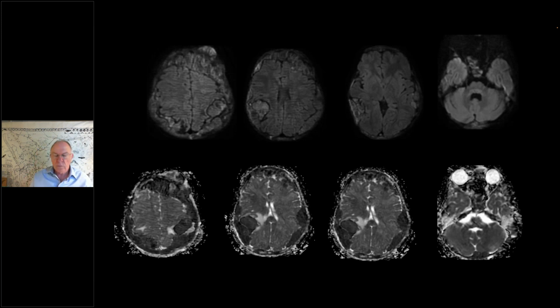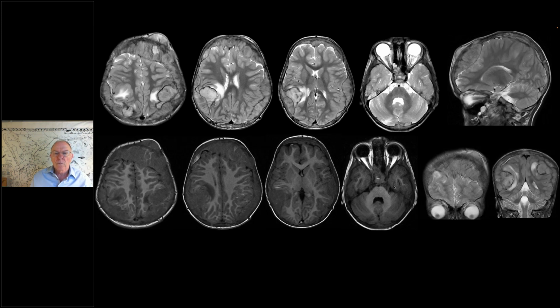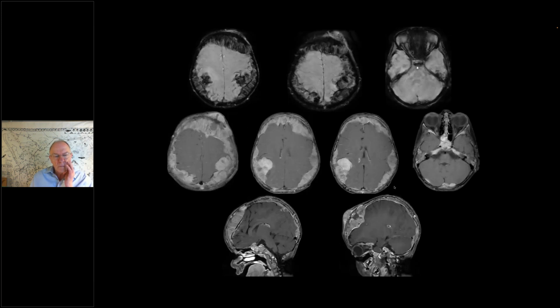I'm just wondering what's happening to the brain, because there's probably dural invasion, right, and edema within the brain, and those cortical folds appear a bit thickened, so there could be parenchymal invasion actually. And is the GRE hypointense, Nihaal, in this? It is blooming, but that is because it is involving the calvarium. Plus, it could be hemorrhagic as well, right? Yeah. So blooming, suggestive of hematogenous infiltration, and the bone usually is dark on GRE, because it is a calvarial lesion.